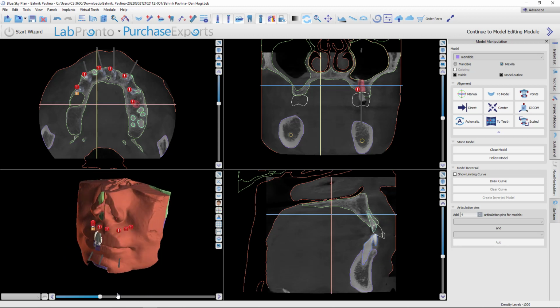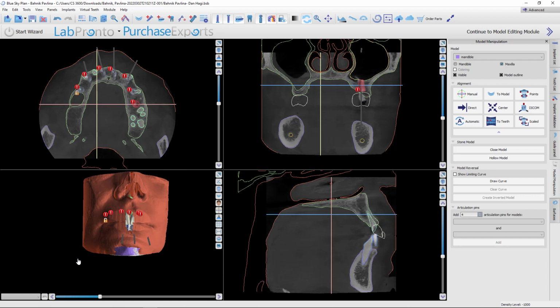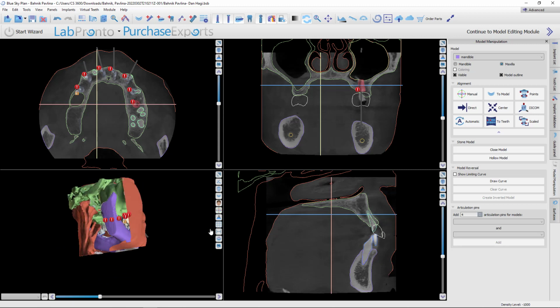But just when you get the data back, it's going to be all those individual files. Now, what's strange, sometimes you pull it in, and I'd say it's 50-50. Half of them come in and they're perfect. They're already stitched. The other half come in like this case did, in which case you just got to use this button. I have talked with them about it. They said it relates somehow to how the scans were exported, but it's a little over my pay grade. Again, it's such a minor thing to just move them by hitting that one button. So either way, that shouldn't be any kind of a hindrance to doing these cases.